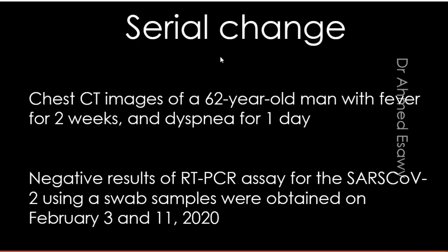Serial change in CT scan in a COVID-19 patient. CT imaging of the chest, 62-year-old man with fever for 2 weeks and dyspnea for 1 day. Negative results of RT-PCR assay for SARS-CoV-2 using swab samples were obtained on February 3 and 11, 2020.